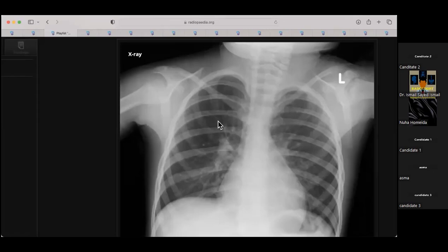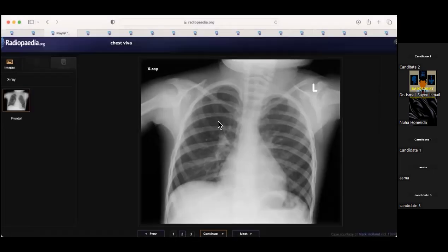Okay. And if I tell you there is no evidence of sequestration, so something much more simple. So children, what do they do? What do they put in their mouth? Scimitar syndrome? It's not typical of scimitar. Let me make it a bit easier for you. So young children, 3 years old, 2 years old, when they're playing, what do they put in their mouths? They play with the Lego and everything. Does it ring any bell?